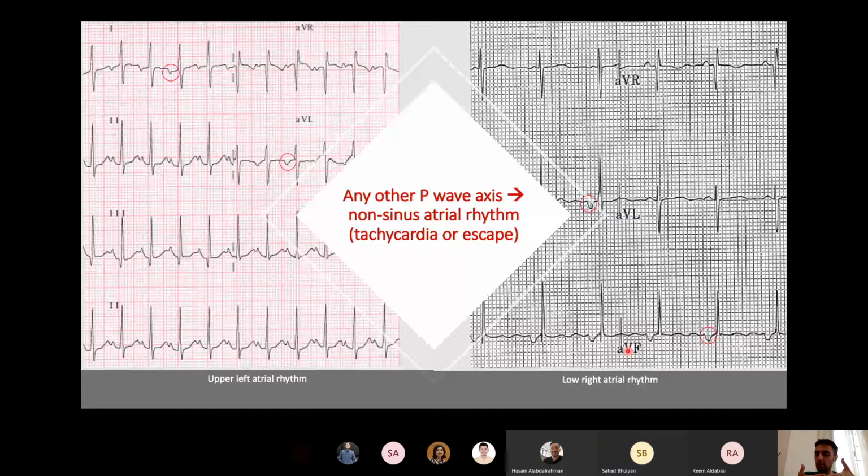It's going away from the inferior atrium, and right because lead 1 is still positive. So it's low and right-sided because the P wave is positive in lead 1. The answer is here, by the way. I don't know whether you looked at this or not.